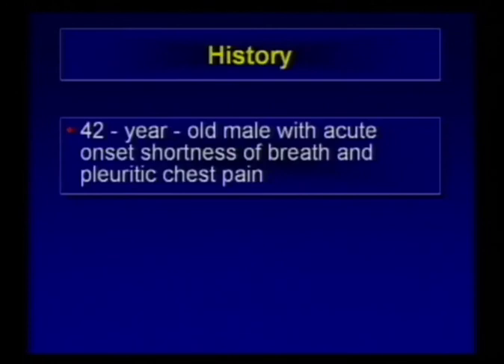42-year-old male, acute shortness of breath and pleuritic chest pain, something we see every day in the emergency room. This is his chest radiograph. Think about how you characterize it, and I'd go through how I'd characterize this radiograph. Multiple bilateral areas of subpleural opacity, probably best term consolidation, although you don't see much of an air bronchogram, except maybe down here. Mid and lower lungs, where it predominates, and the opacities, if you characterize them completely, are roughly triangular with the apex cut off, with a truncated apex. That's a pretty suggestive diagnosis or description.